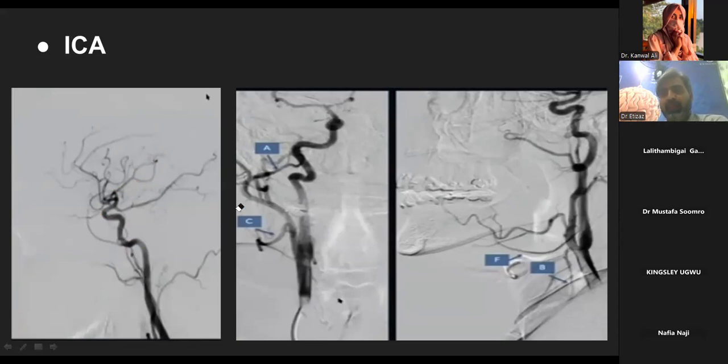Okay, so now please, this is which side? This is the lateral view, the first one we have discussed. Both other views, which side? Look at here now, Dr. Kamal. This is the petrous part, right. This is the clinoid part. Am I right? So the petrous part on the right side and the clinoid on the left. In the AP view, it is opposite. Look at here. This is the AP view of the left-sided internal carotid artery.